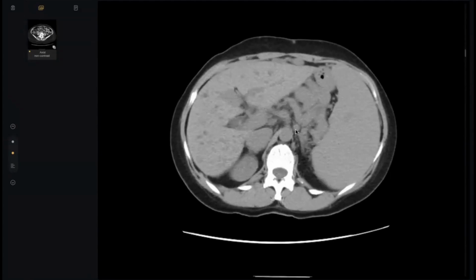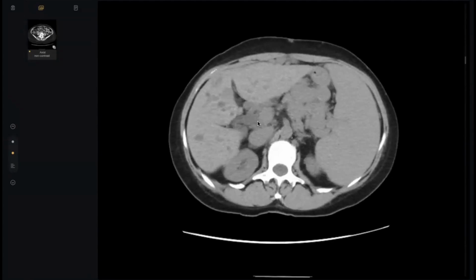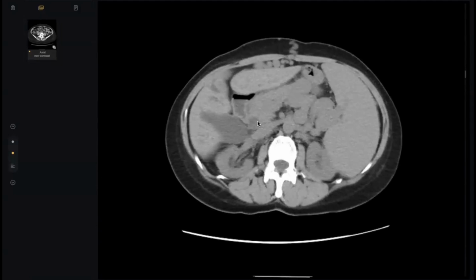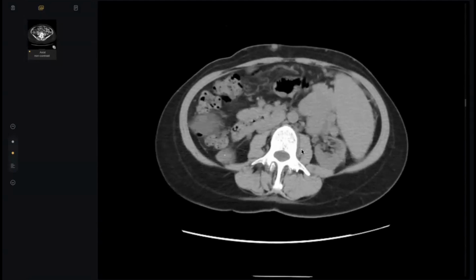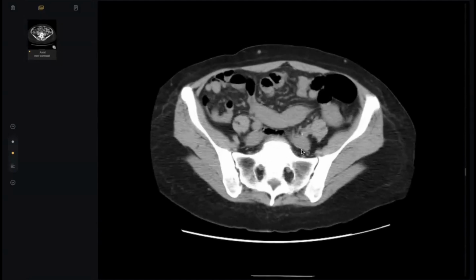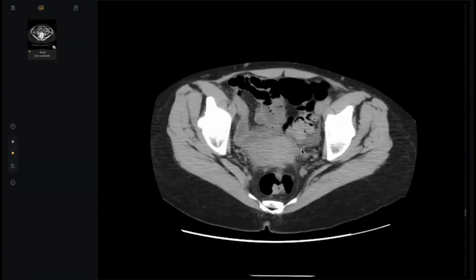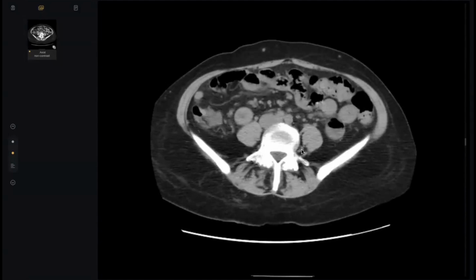What is this? Follow it, please. What is this? Oh, yes, I see that. Those are collaterals, multiple dilated collaterals, and that was the portal vein. So that may indicate that there is portal hypertension. Okay, give me a professional diagnosis, please.